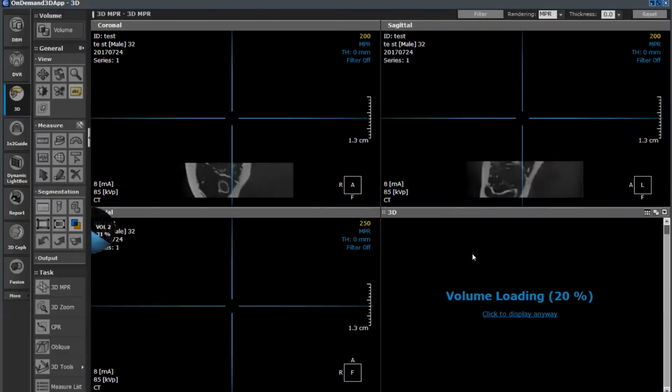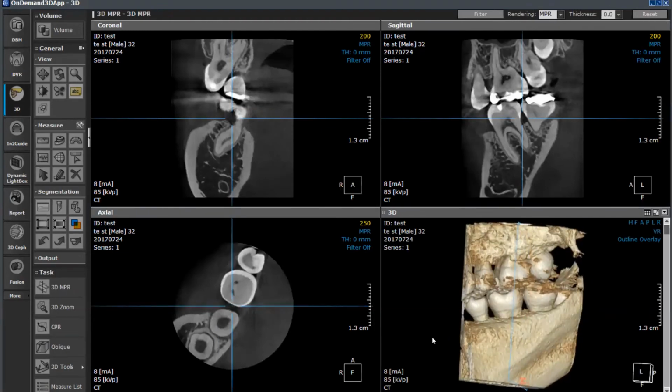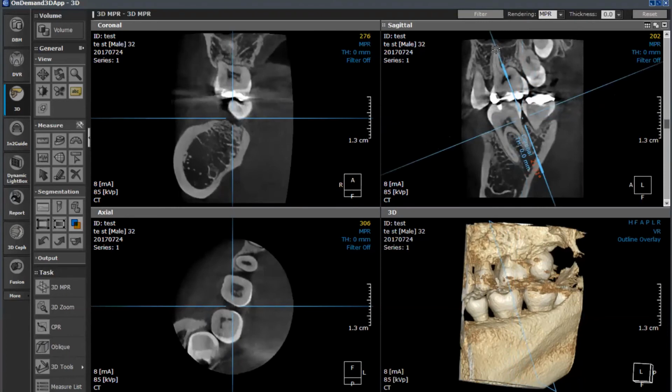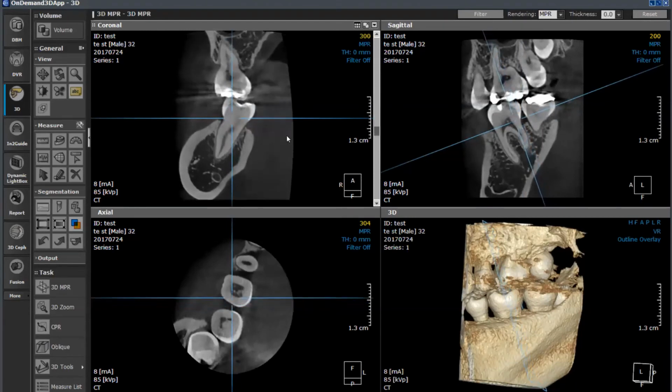So this is a different patient, but again, just trying to give you a sample of an idea with being able to have this free field of view, is that I can now focus on just that section of teeth and then evaluate. So again, I can still do the same, where I can do buccolingual, mesial distal, and then evaluate that tooth as it comes across and gives you that.